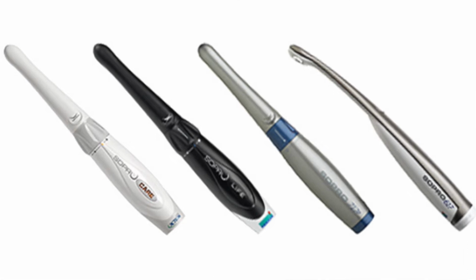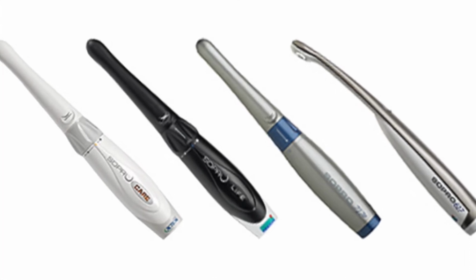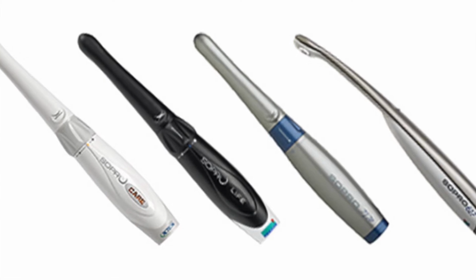Hi, I'm Kevin with Acteon, and today I'm going to show you how to install Sopro Intraoral Cameras on Eaglesoft.